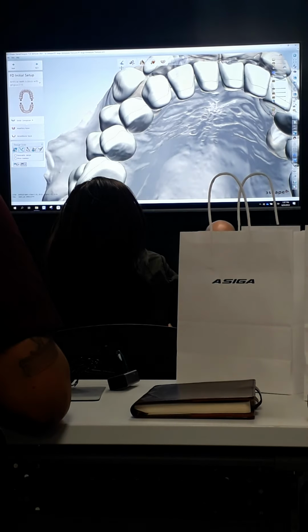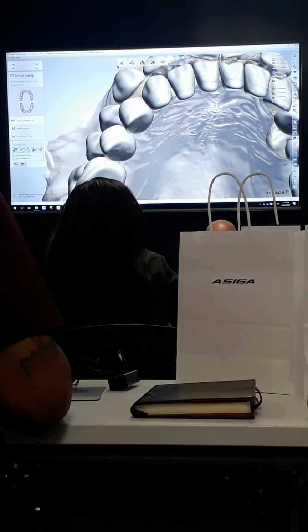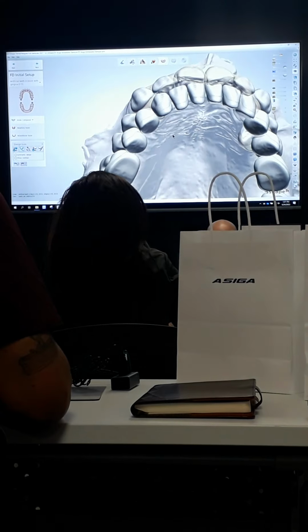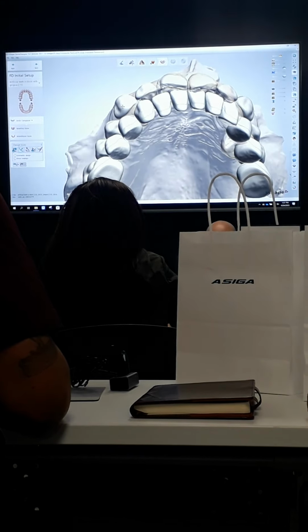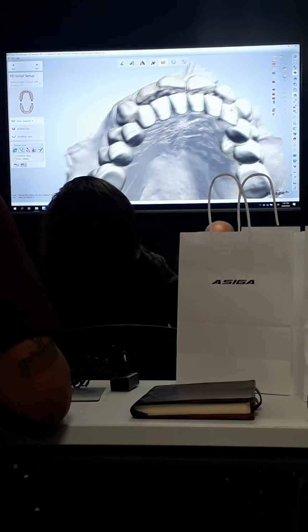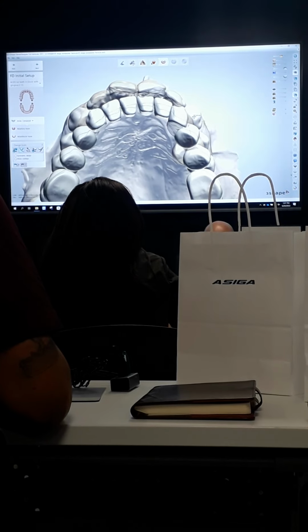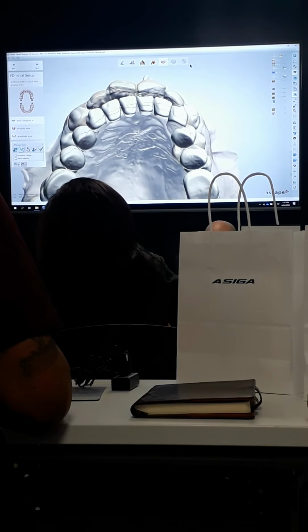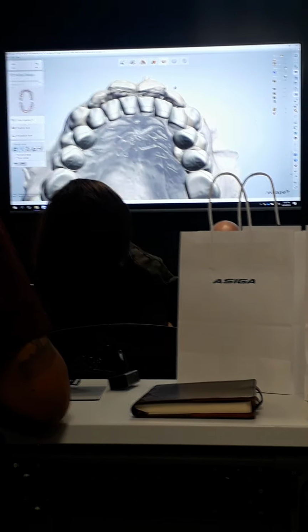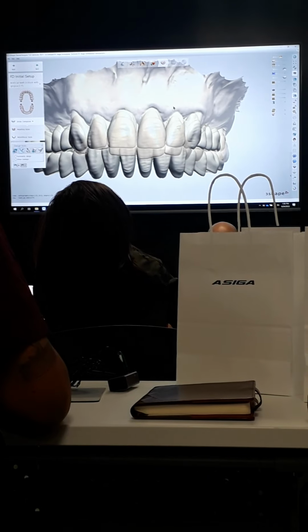So I can see right here that my canine is too far out from the original canine. Now, it could be that the original teeth are a little crowded, but let's just say I was trying to follow this as close as possible. So if I left click and grab from this canine, I can pinch in my arch. Everyone see that? So I'm going to do the same thing on the other side. This is how I can set my corridor for the look of the posterior. So now I'm more in line with the positions of the anterior teeth here.